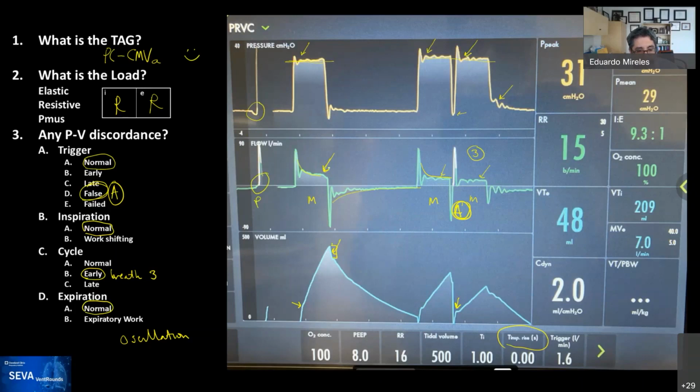Just based on this, I was not entirely sure because you get so close to baseline here. I thought that is likely the cause because the way I thought about it is that the flow ended, and if it had continued, it would look just like that, right? Yeah. That's why it's a little bit lower.